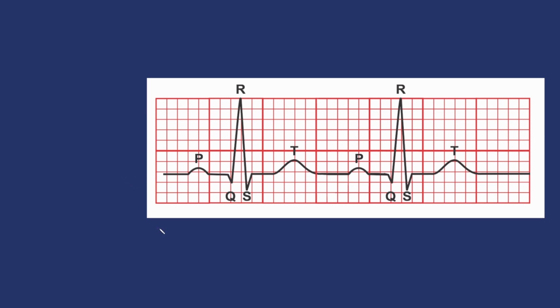So we have our left to right axis, so it's going to run this way, and that's going to be time. Okay, and time itself on the EKG generally is going to be 25 millimeters per second, and that's in the US. That's the US standard. If we're in another country, or if you're in an electrophysiology lab, you're going to see a 50 mil per second standard. So it's important whenever you see a 12 lead EKG or anything like that, you check the bottom left hand corner. If you're watching this and you're a nurse, you don't really need to worry about this too much. Majority of them are going to be set to 25 mils per second, especially for telemonitoring.